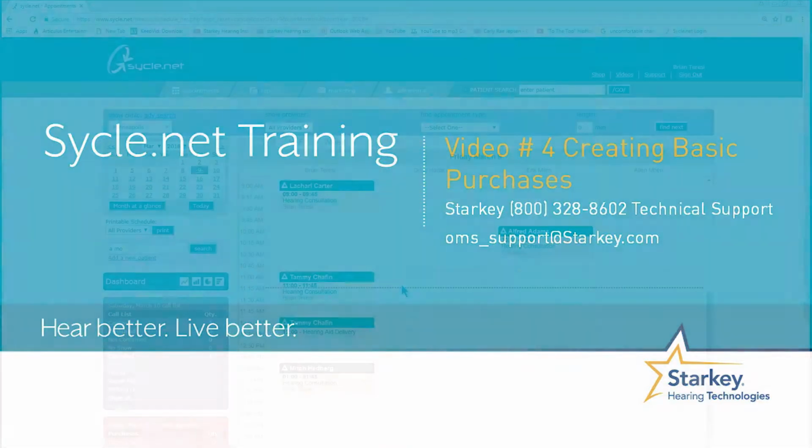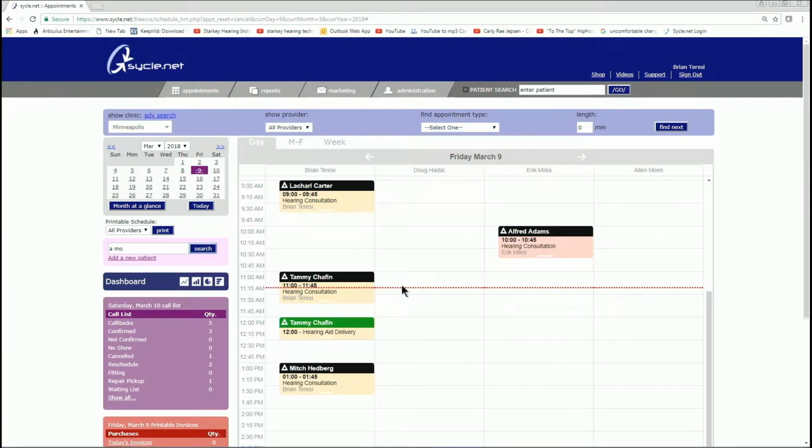In the previous video, we talked about creating patients. In this particular video, we're going to talk about creating a quick purchase. Maybe a patient walks in who has never been in your office before and just wants to buy batteries, or maybe just wants to get some Hear Clears or things of that nature. I created a patient named Al Moen, and maybe he walked in and just wanted to purchase batteries.